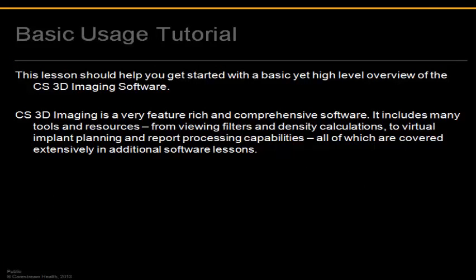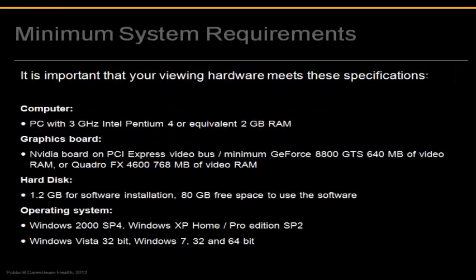You are now prepared to use the basic functions of CS3D imaging. We have lessons available to cover all aspects of the software, so please explore our other tutorials. Please also take note of the system requirements for best software performance.